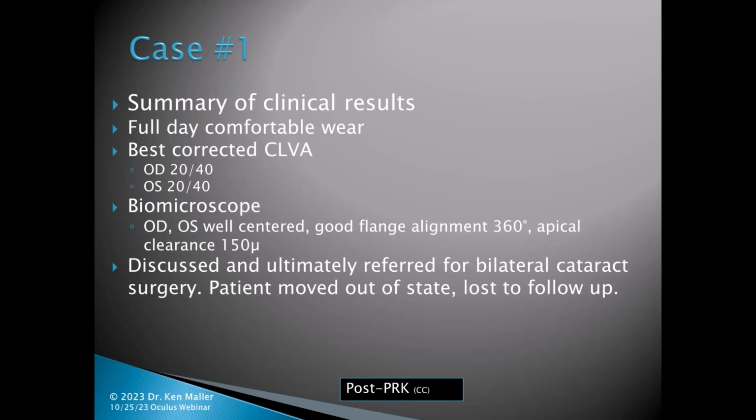And so we see, even at the beginning of this, before I even designed up a scleral lens, I did have that conversation that my gut feeling from all of the data that I was able to collect clinically, that the cataracts were the main player here, and clearly that did turn out to be the case. Okay, let's go on to the second case.